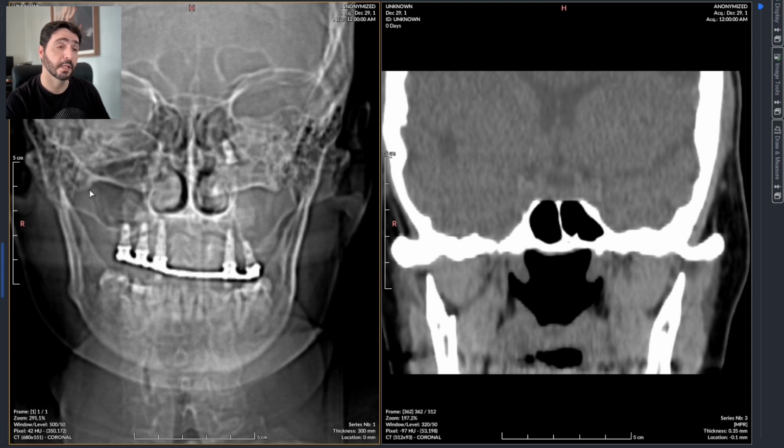You can see here the right maxillary sinus is okay, it's normal, and the left is completely opacified, even on the X-ray, and right there on the topography of the outlet of that sinus there is a metallic object that resembles exactly the same morphology and attenuation of the other anchor points of this prosthetic teeth, this teeth prosthesis.